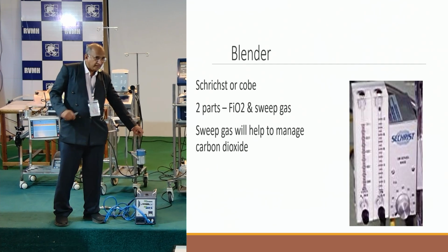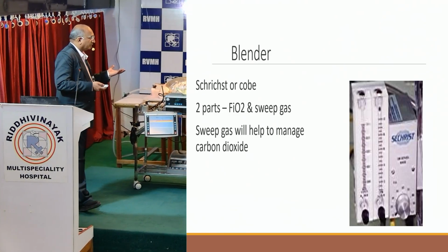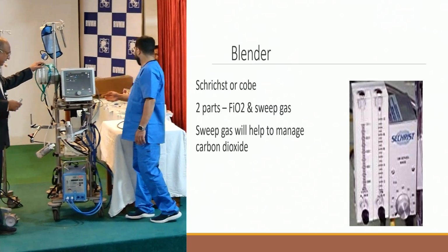No, blood is not coming. I'll show you when I come to the oxygen, I'll show you how it moves. Okay. Then there is a blender. This is the blender.